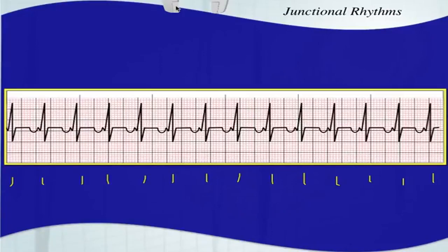Now these don't occur nearly as often as sinus tachycardias, and in fact they're very, very rare. Junctional tachycardia, you typically only see as a reperfusion rhythm after cardiac catheterization for a myocardial infarction, so it's not that common.